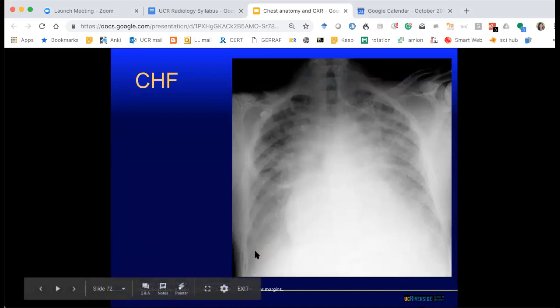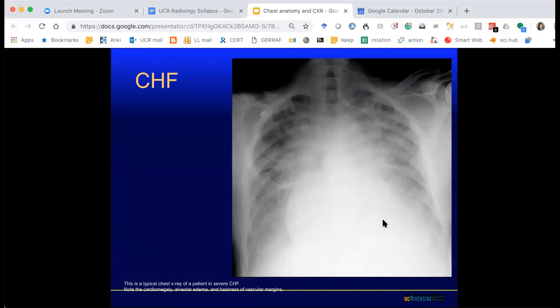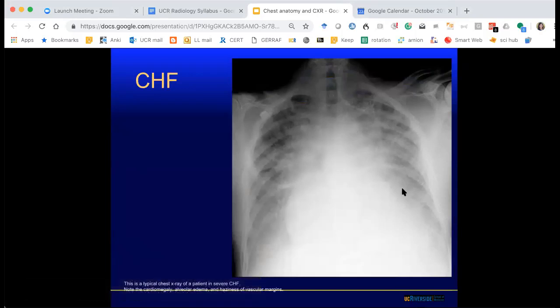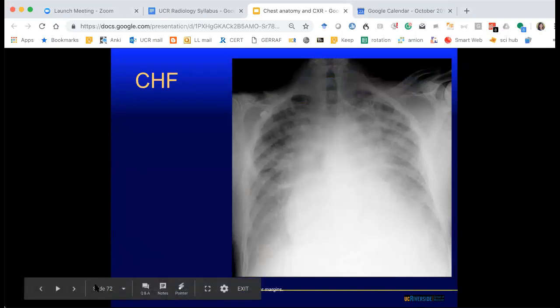Patient's probably supine, so you're not going to see the normal crescent pattern because it's not going to layer. So what you see instead is this haziness that comes up because the patient is supine. Same thing on the left. So there's probable underlying effusions bilaterally. So the lungs, pleura, and look at the heart. What do you think about the heart? So the cardiomediastinal silhouette is markedly enlarged. And you look at the soft tissues and bones. They're probably normal here. So this is CHF.